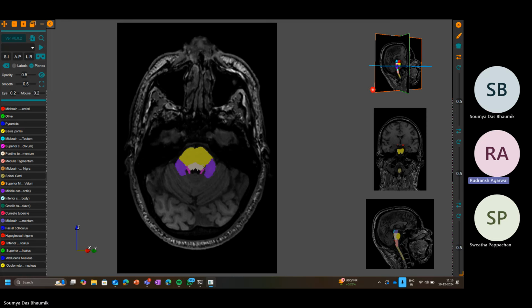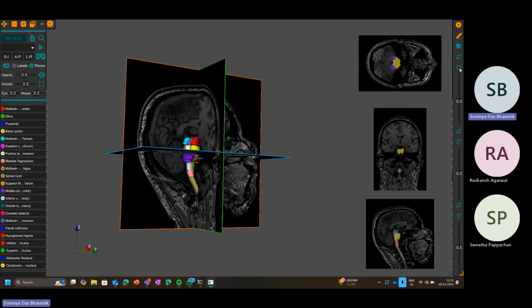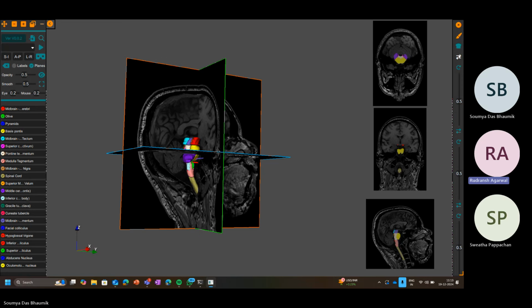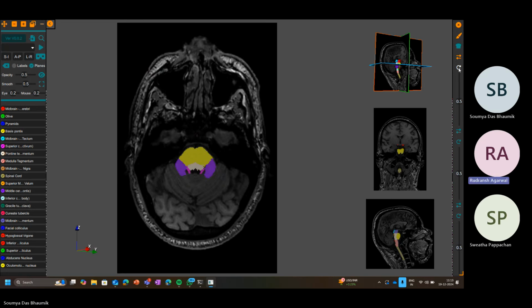Also, in order to rotate the view, use the arrow below the one you just clicked, not the one above. Yeah, the round one, the one below that. This will basically just rotate your view around. Yeah, that's it. Got it.